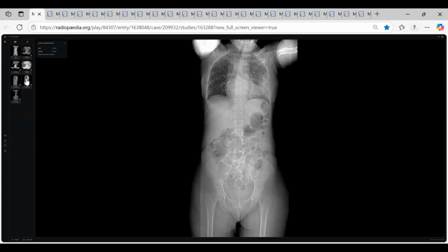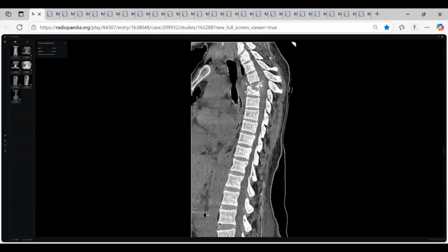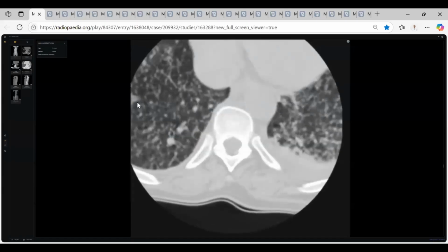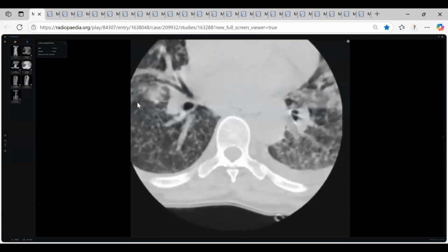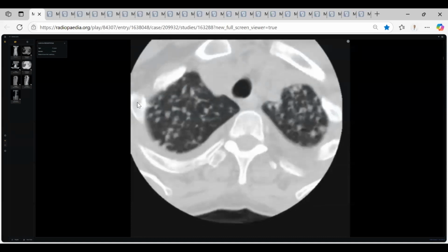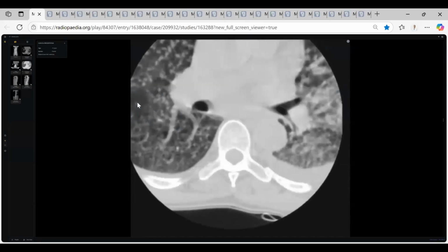Second, here there is a prevertebral and intraspinal extension. This is very critical. Take care, my colleagues, from these minor mistakes, but critical. Second, don't neglect anything that the examiner will show you. I selected this especially not for the spine, but for the lung, despite this not being a lung examination.